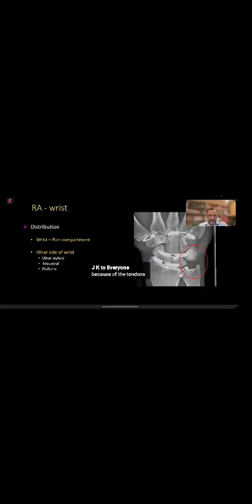Yeah, somebody, JK, said it's because of a tendon. Which tendon is there? ECU, very good. What else? You think one tendon will do everything? You're right. But somebody, Venkatesh, said there is synovium in this region, and that is probably the right answer. Okay, let me just go back.